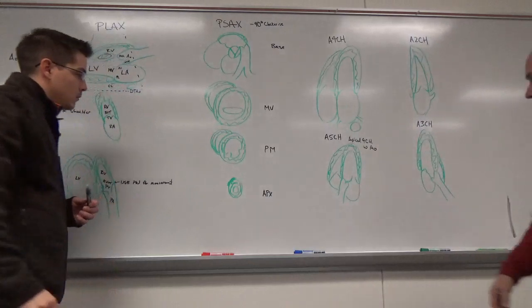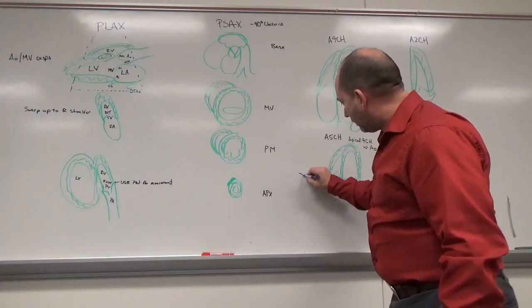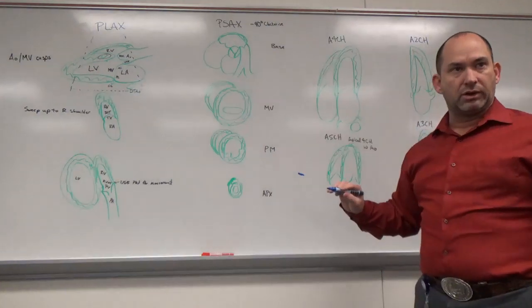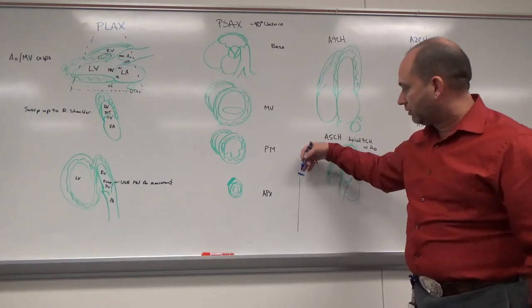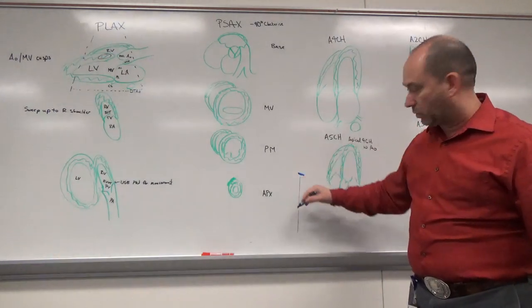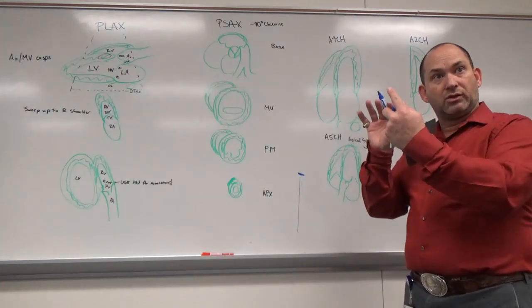Just a point to, if I've got a transducer up here and it's kind of pointing down, and I'm looking at a structure and I want to see it in 90 degrees to it, I need to have that straight down the center, because when I turn this 90 degrees, this is my beam turning 90 degrees. So whatever this line goes through is what's going to be turning in my image when I spin it.